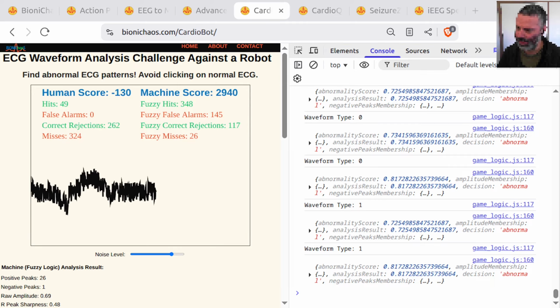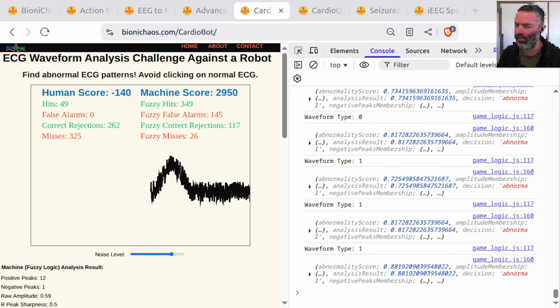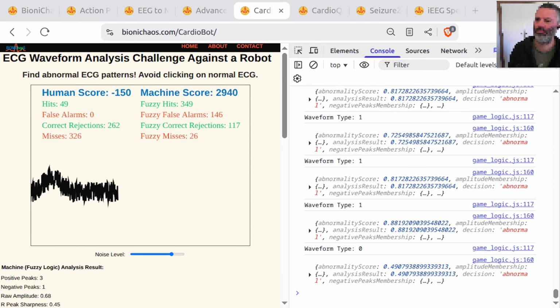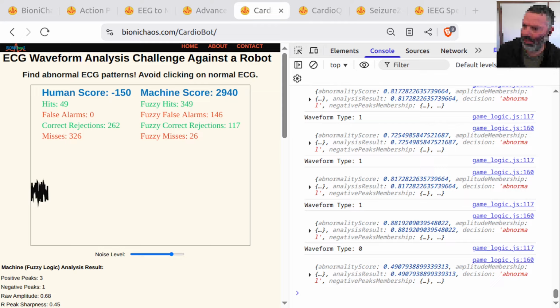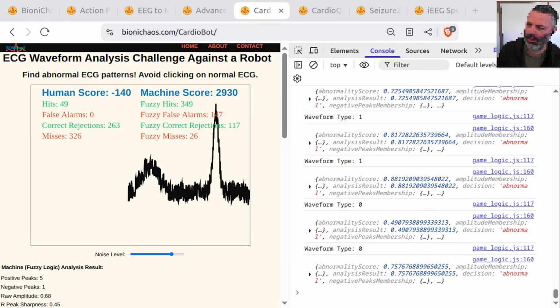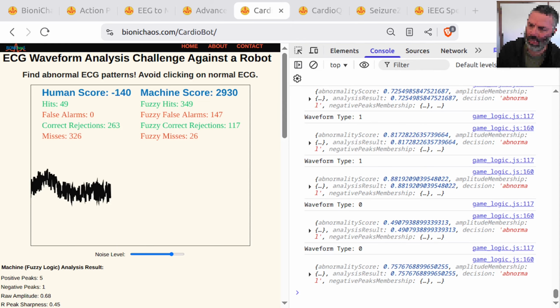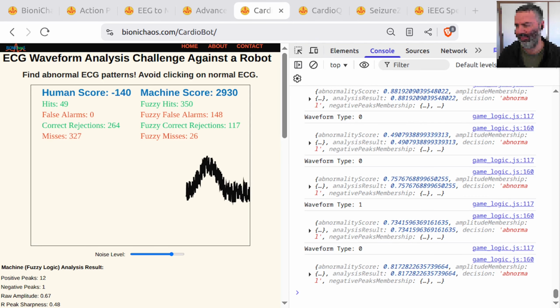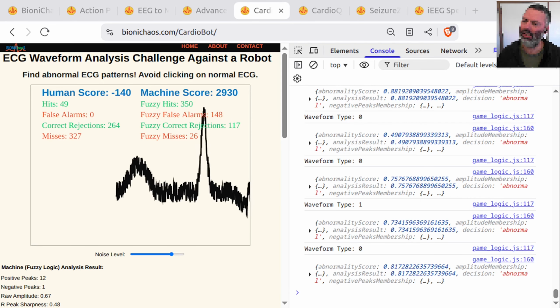Yeah, a few areas. Well, why is it generating the code? Yeah, so the direct PQRST wave detection in vanilla JS is not clear. I haven't found a direct JavaScript implementation for calculating the width at half max.